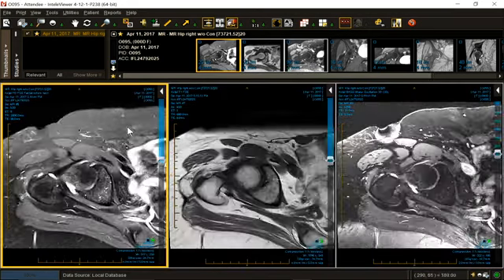See if we can cross-reference it. Very tough. There it is right there. There's a tear. It's a little bit more posterior. Let's check out the sagittal on this one. Well, you're parallel to the tear. You're tangent to it. It's right there. You could easily blow right by it. The ones that run from back to front this way, horizontally, they show up better on the sagittal.